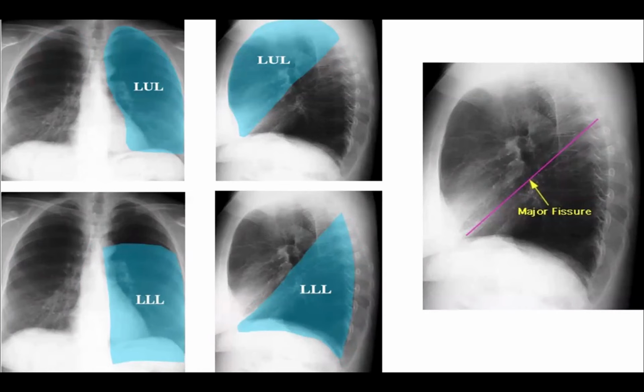That's why, most of the time, the correct terminology when you describe abnormalities on a chest radiograph is that you don't say lobe if you're not confident enough to locate the pathology, but rather you describe the abnormality location per zone: upper zone, middle zone, or lower zone if you're not sure. But we will talk a little bit about localization today that can help you to locate your abnormality if it is within a particular lobe.